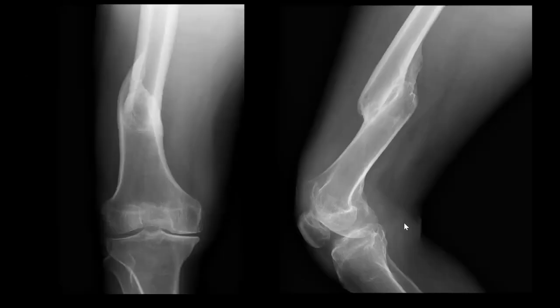A radiograph of right knee AP and lateral view shows malunion of fracture of distal shaft of femur with osseous hypertrophy, generalized decrease in bone density with reduced medial tibiofemoral joint space and marginal osteophytes, suggestive of grade 3 osteoarthritis. Diagnosis based on radiographic findings was given as malunion of distal shaft of femur fracture.